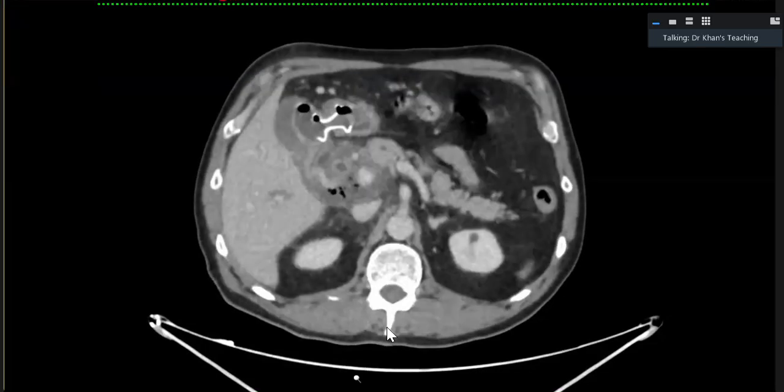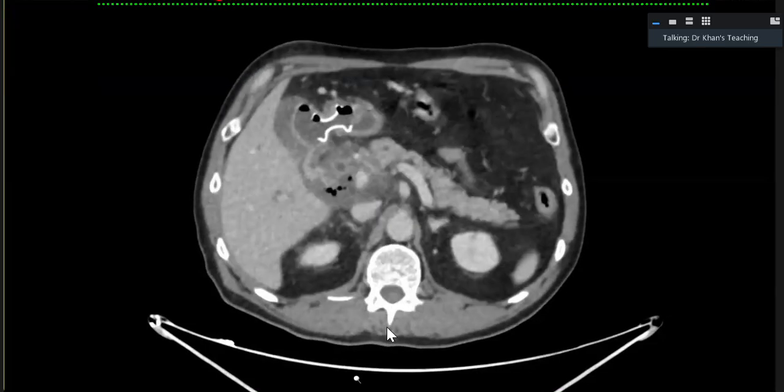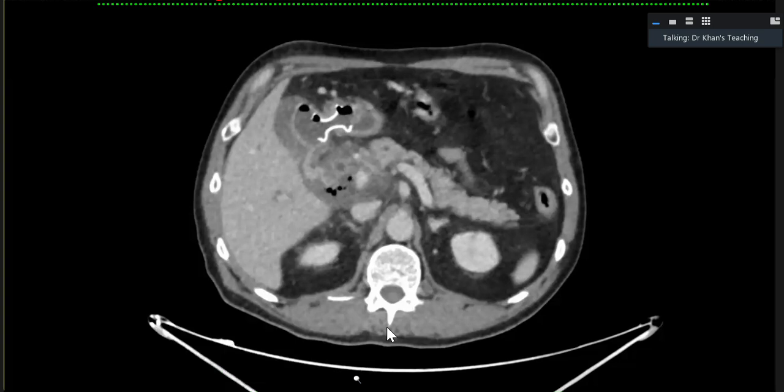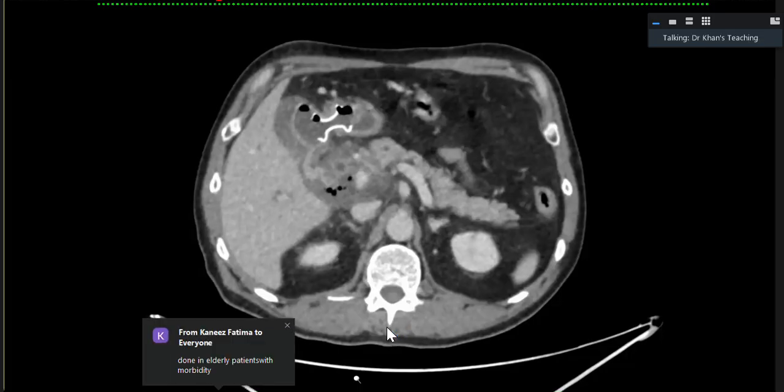In the FRCR exam, this happens whenever some new device comes and things like that. By the way, it has been happening for 20 years. They will show you what is this, that kind of a thing. So this is a very, very good case to learn something new. This device, if you Google it, Axios, Boston Scientific. So this is a self-expanding stent, a very interesting shape.